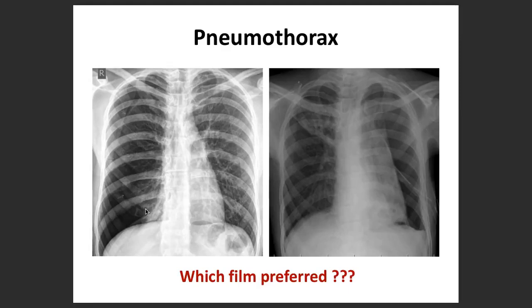So what is this one? Already I have given the diagnosis: pneumothorax. Why is it pneumothorax? Now the question comes, why is it pneumothorax?